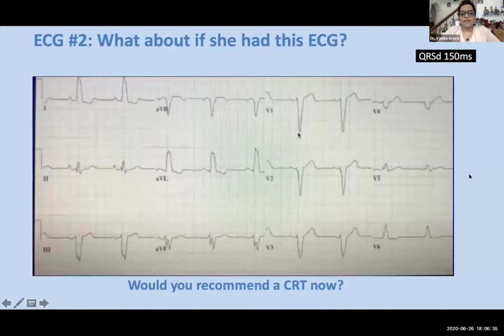Please, may I see the result, please? Yeah, so everybody thinks this is recommended, and that is a beautiful answer, because you see here the criteria are fulfilled. The QRS is wide, it is 150 millisecond, it is left bundle branch block, and though there are some notching there which we will just discuss, it is the indication for a CRT and a good result for that.